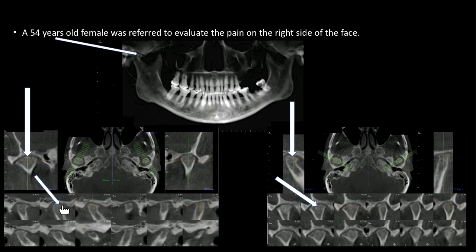That means chronic inflammation in that area. So whenever you see something like that, or you also see a subchondral pseudocyst, that means you will have degenerative joint disease. There's a flattening on the right side. Degenerative joint disease on the right side, and on the left side you can also see the same thing: flattening, osteophyte, erosion. So it is very interesting how they look at it. Okay, so that's how I diagnosed this as a degenerative joint disease. So basically, they have to go and check for the disc and other areas.